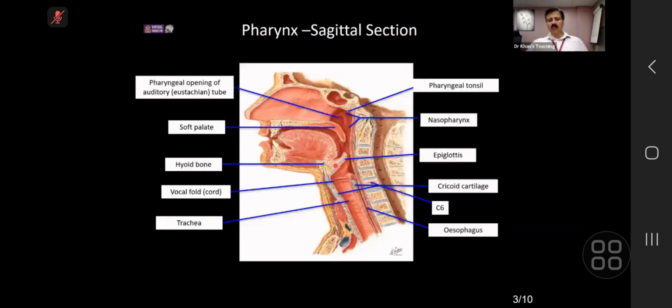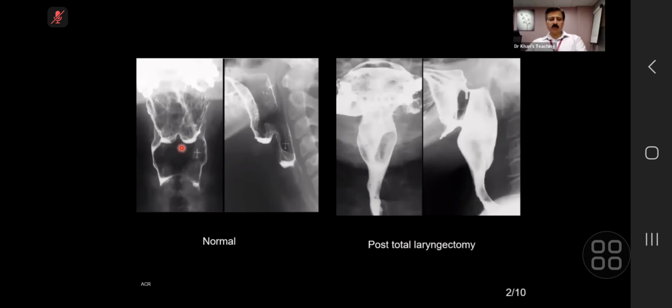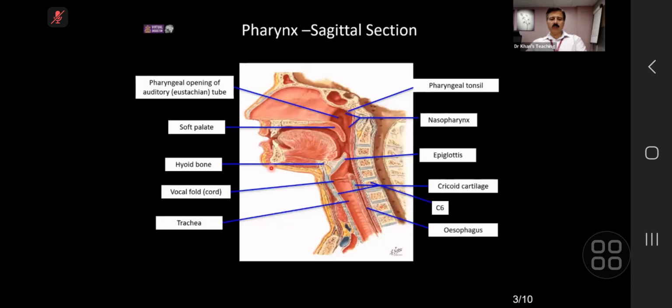So there is a connection between the midline tongue and the hyoid bone and the epiglottis, and that actually forms this midline indentation here. This is that glossoepiglottic and the hyoepiglottic ligament together, right vallecula, left vallecula. So this is a very important point to remember.